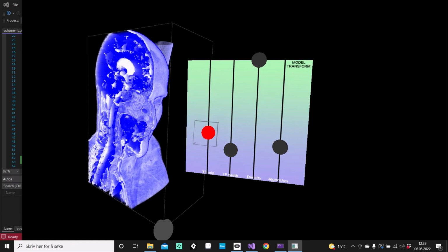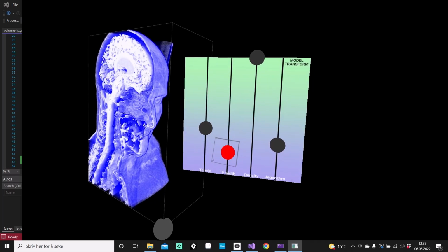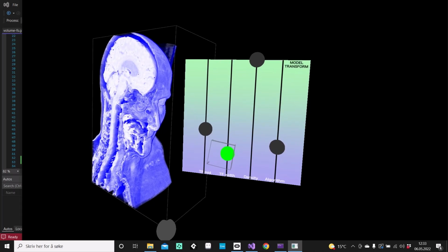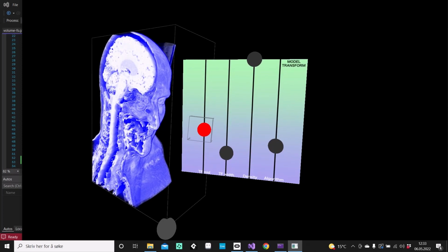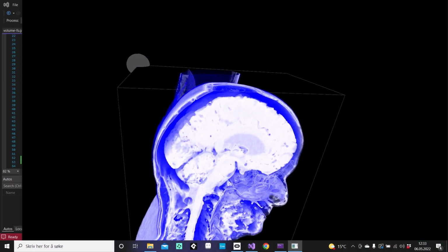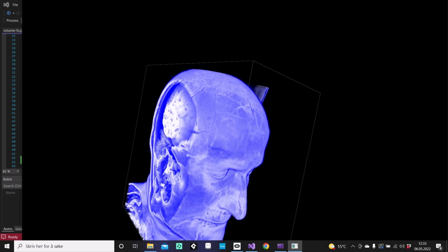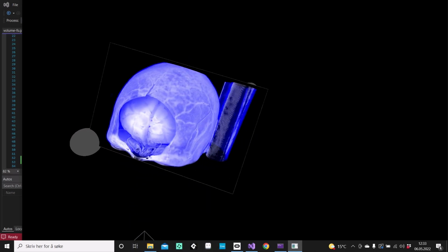So with this example, let's say we want to view the brain. You start out with a wide range and use the mid slider to find a fitting center value. Then you move between the two sliders, narrowing down the data range while updating the center value until you have reached a good range setting. Getting the data range as narrow as possible removes unwanted noise and heightens the fidelity of the structure you want to view.